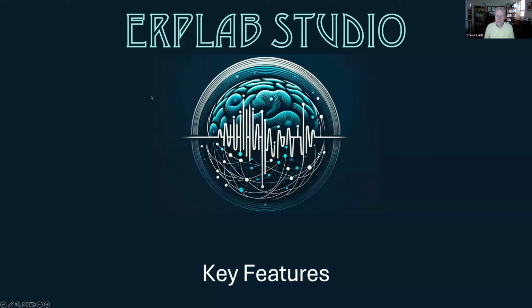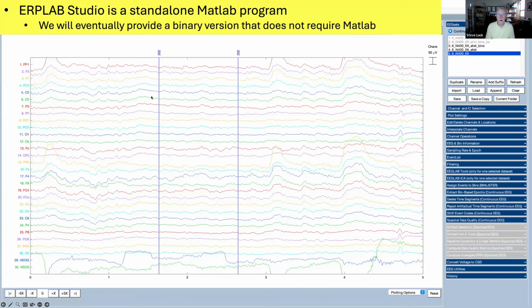Okay, so ERPLAB Studio is a standalone MATLAB program. The original version of ERPLAB, ERPLAB Classic, is a plugin that runs inside of the EEGLab graphical user interface. We abandoned that for ERPLAB Studio. It's its own program, but it calls the EEGLab and ERPLAB code.